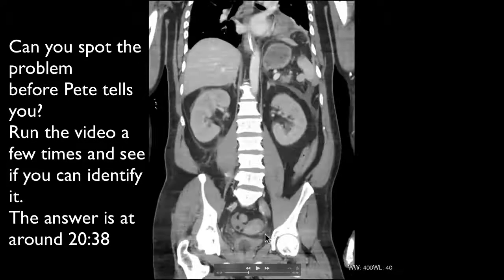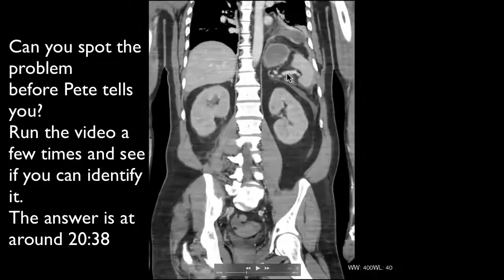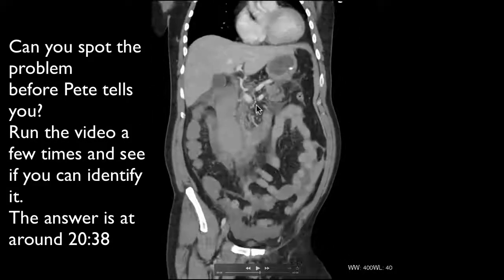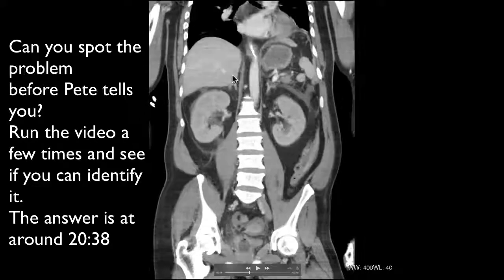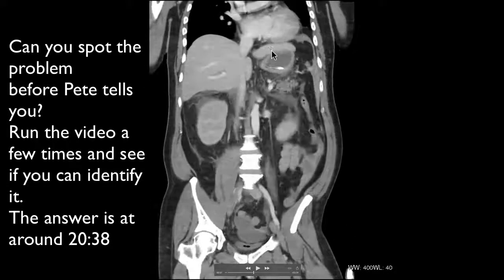So in this patient it's quite nice because you can see the splenic vein really clearly, especially on these coronal images. That's the splenic vein going out towards the splenic hilum there. And you can see it coming over to the midline here where it joins with the superior mesenteric vein to make the portal vein going up there. Yeah. Those are the kidneys there.